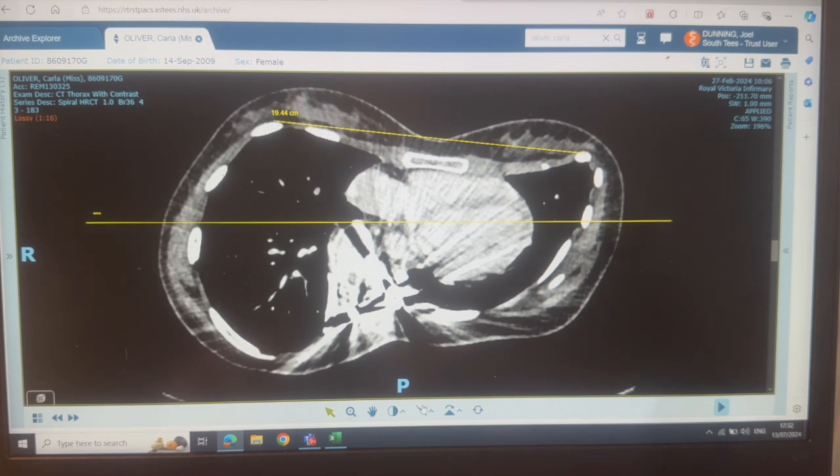And then where's the deepest point? Well, the deepest point's over here. Crazy, hey? But I'll still measure it. It's still the minimum depth. That's going to be AP min. And AP max is going to have to be on this side, because there isn't a very big AP max on that side. There we go. And then height of the left chest is pretty tiny there. Height of the right chest.